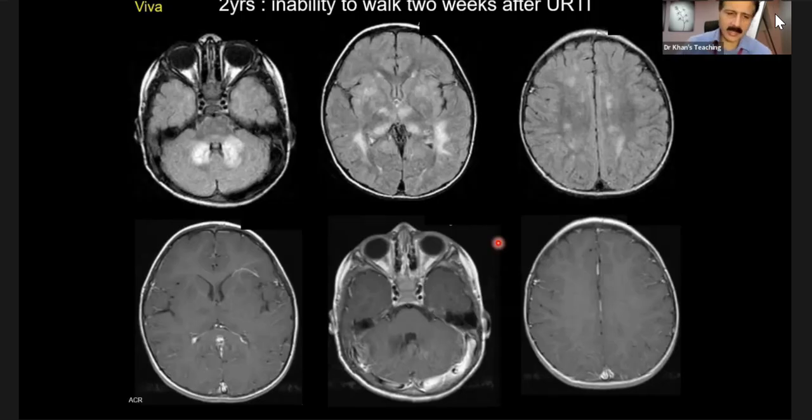Right. So, acute disseminated encephalomyelitis is a monophasic illness in which, as we discussed previously, the white matter abnormalities will be slightly larger or confluent as compared to MS, which can also present with larger lesions. One of the key exam points to remember is that other than white matter, at times, deep gray matter is also involved. So remember this. This is an exam point in ADEM. Not in each and every case, but sometimes it is. And this is what the examiner is going to ask you.